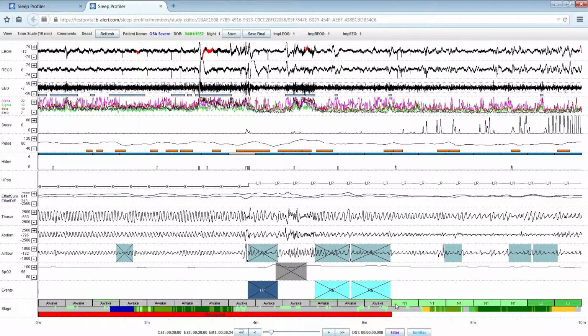The auto-scoring identifies sleep onset right at the point that the snoring begins. These 2 RERA events are not being called because these epochs are staged awake. They do not look like significant sleep disordered breathing, so I'm going to leave it as it is.